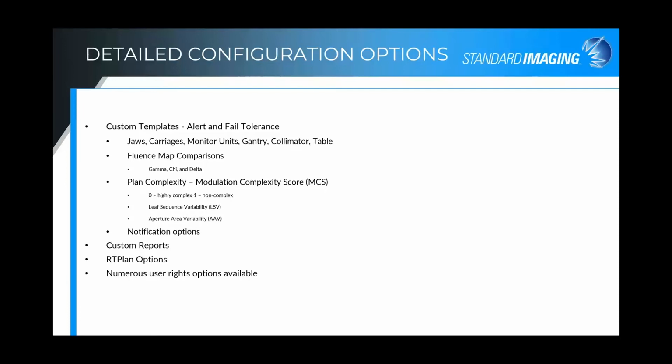So moving on, in order to allow for automatic analysis, doing all this matching, one sets up templates to provide automatic notifications. All the parameters are analyzed all the time, but reports and alerts are only generated via audible alerts or email alerts when the custom template parameters are beyond the limits specified for the individual limit.